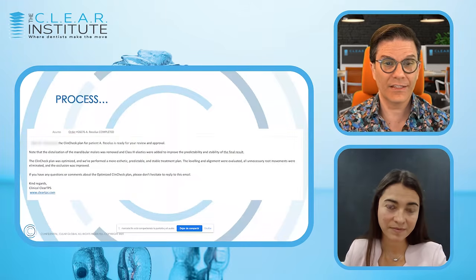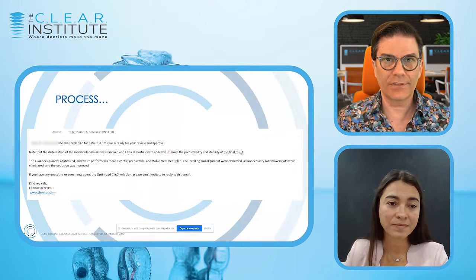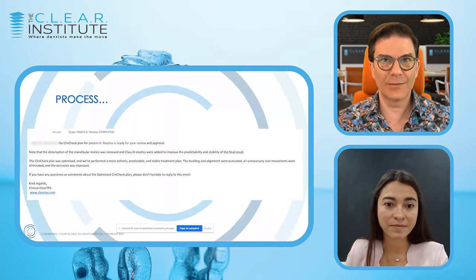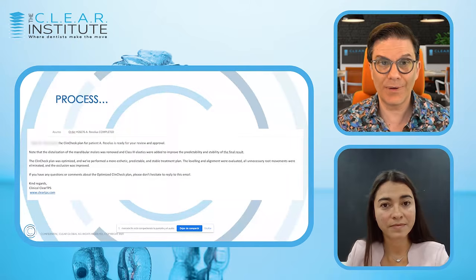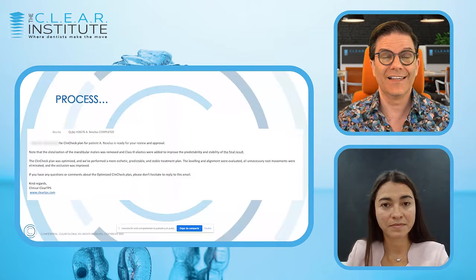The other thing, Dr. Garro, is that, like you said, most of the jobs, like 90% of the job is done. I want to do some simple modifications. I can do them myself, but let's say I'm not comfortable even doing these modifications.